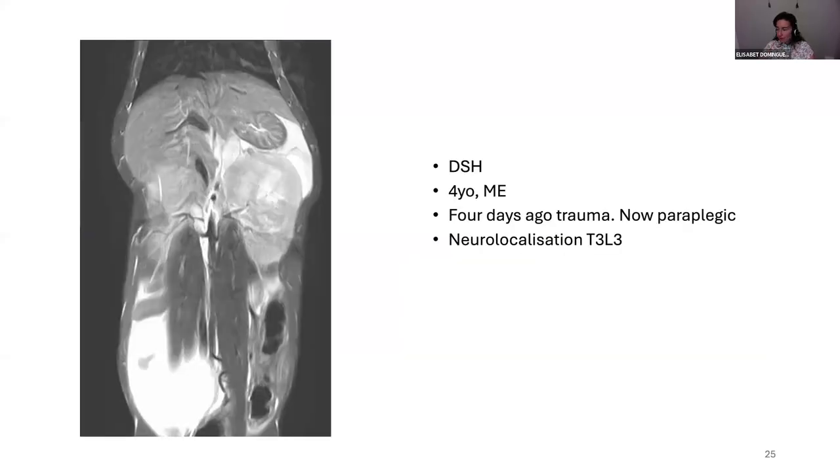So from here until the end, we will review different cases of animals that had a traumatic injury to the vertebral column, and we will see different clinical presentations or different lesions, both with MRI or with CT. This is mainly because a traumatic injury will be very different in every animal, because it depends on the trauma. It's not like ischemic myelopathy, which may follow a pattern. In these cases, we will see something very variable depending on where the trauma was, the timing of the lesion, if it is acute or chronic, if the animal has several lesions or a single lesion, etc.